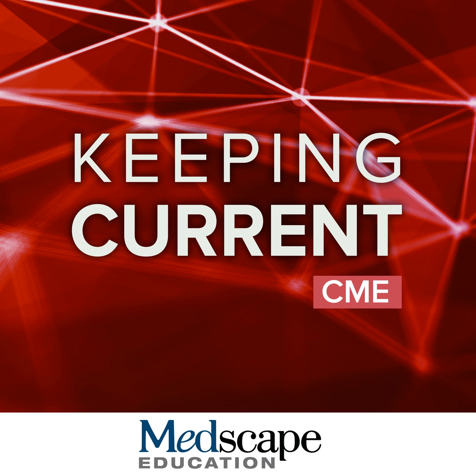Incomplete nulling of the myocardium I showed you already. As shown on the left here, you see the bright signal in the magnitude image on the left. The phase-sensitive images, which are reconstructed from the same algorithm, show adequate and complete nulling of the normal myocardium. And then finally, for patients with devices, we cannot use the standard techniques because we get all of this artifact over the myocardium. You need to revert to this so-called wideband late gadolinium enhancement technique, and you can see that it significantly improves the artifact both in perfusion images as well as on late gadolinium enhancement imaging.